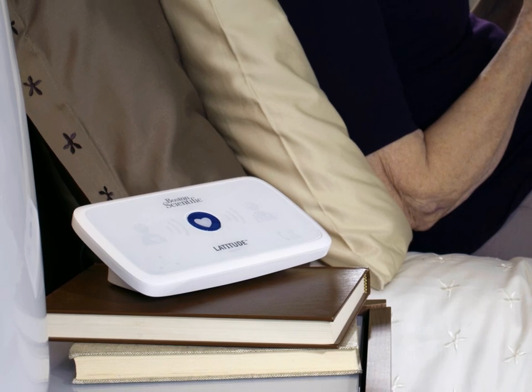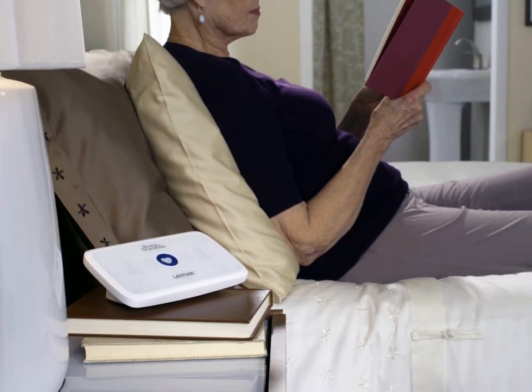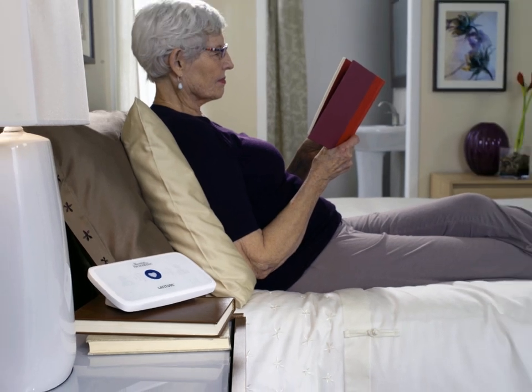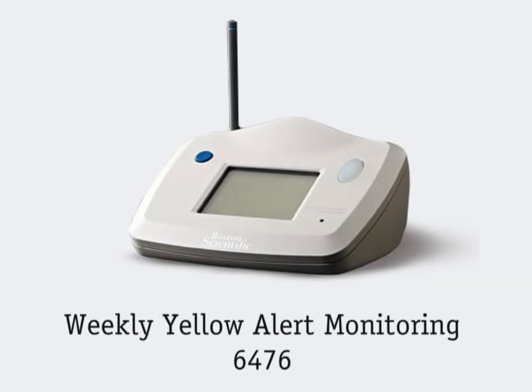There are two levels of alert conditions: red alerts and yellow alerts. Transvenous patients are monitored daily for red alerts. Latitude NXT features daily yellow alert monitoring for transvenous patients with the 6290, 6280, or 6498 communicator. Patients with the 6476 communicator have the option to be checked for yellow alerts on a weekly basis.